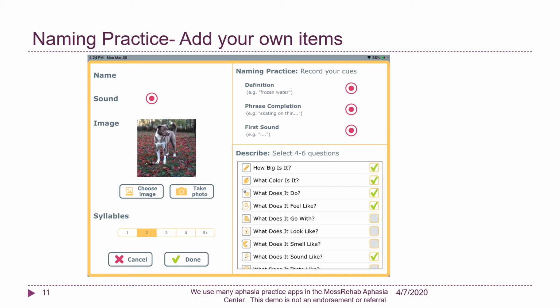And the next thing we're going to do is record different information. You'll see that there are little red record buttons on the page. And after we write her name, we'll record some sounds and some words. So the first thing I'm going to do is type in her name. My girl's name is Maggie. Then I'm going to record her name. So I will press that red record button and then say Maggie. If that is difficult for you, you can ask someone else to do the recording.